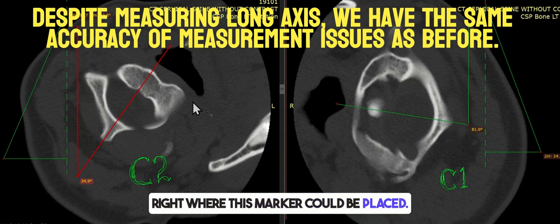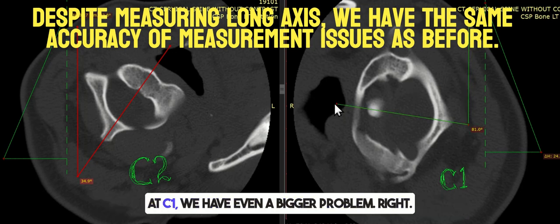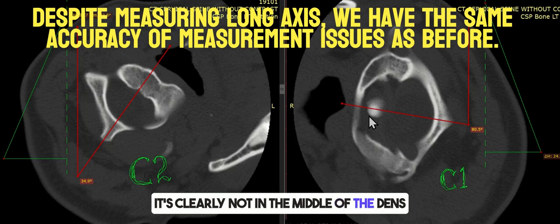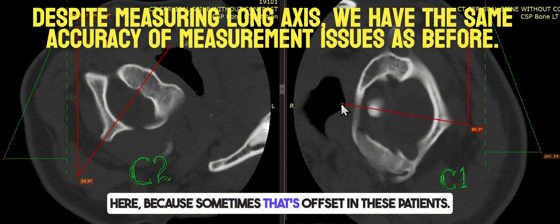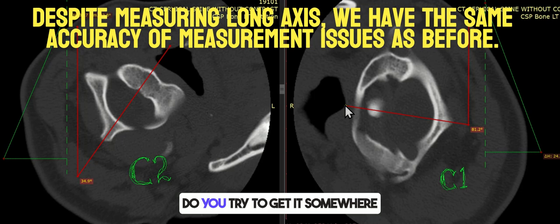could be placed. Now, with the patient's head turned the opposite direction at C1, we have even a bigger problem, right? Where do you put this marker? It's clearly not in the middle of the dens here because sometimes that's offset in these patients. Is it here? Is it there? Do you try to get it somewhere in between the two lateral masses? Again, the accuracy of this is going to be very low as a measurement.